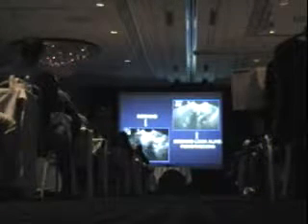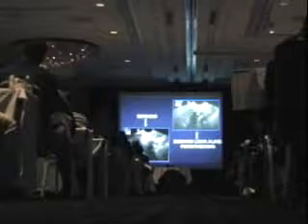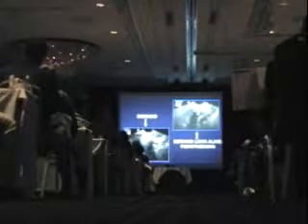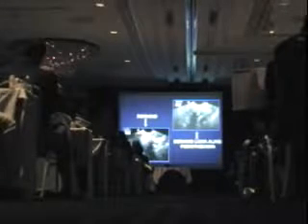Now, also, you're never 100%. Here's a dermoid. When I looked at that, I said, if that's not a dermoid, I'd eat it. And I would serve this on a tray with sesame seed bun and pickles and relish and all that kind of stuff, because it looks just like a dermoid. So you can never be 100% sure. And also, dermoids have variations.